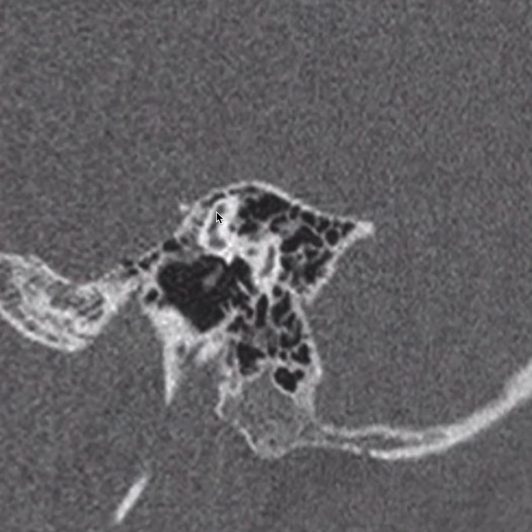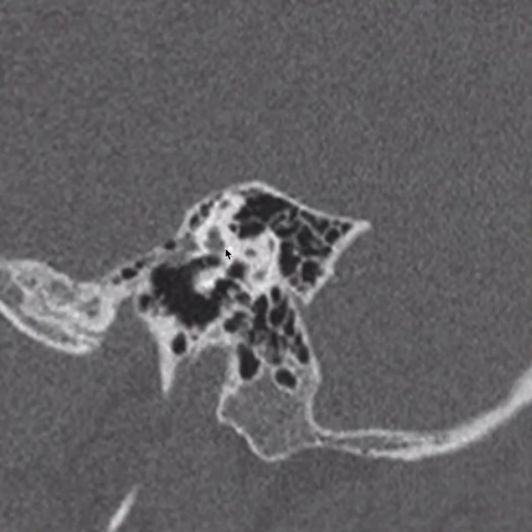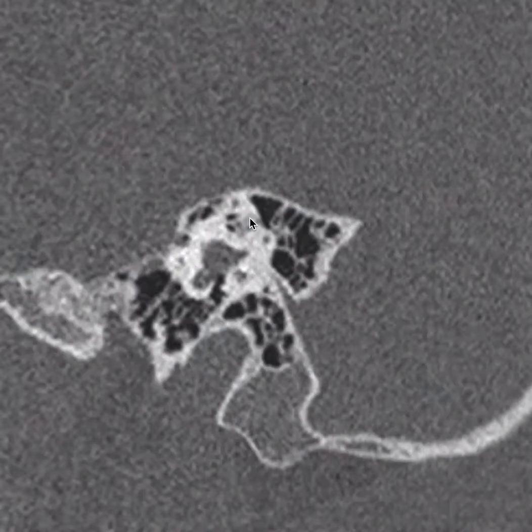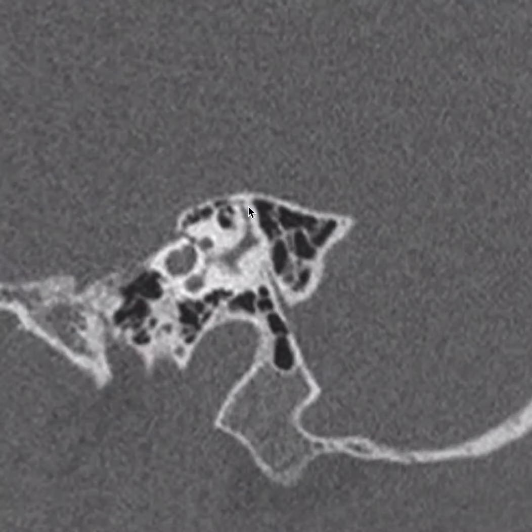Here's our superior semicircular canal, which I can scroll medially to see the full extent of. The bony impression it makes right here is called the arcuate eminence. It's important to make sure that this is all intact to rule out dehiscence of the superior semicircular canal. Here we see it connecting posteriorly and reaching this structure called the common crus. It's called the common crus because it shares the connection with the vestibule with the posterior semicircular canal, which we see coming off right here.